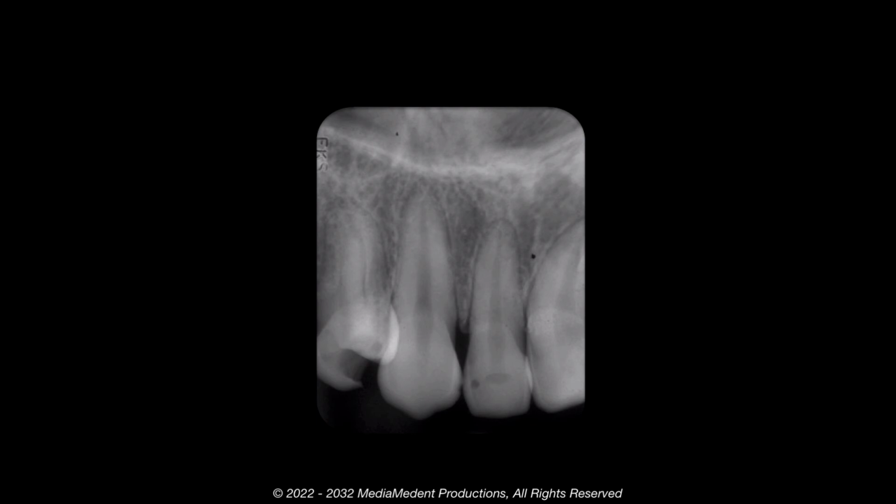To distinguish between cervical burnout and caries of the root, remember that first, cervical burnout appears as a radiolucent zone with ill-defined margins in the cervical area of teeth, while root caries is imaged as a more definite saucer-shaped radiolucency on root surfaces exposed by gingival recession and alveolar bone loss.